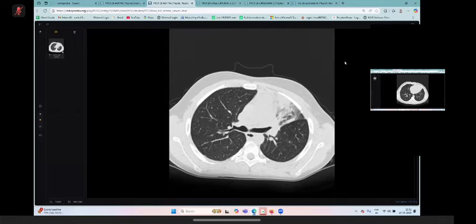All right, you did very well on this case. The only thing I would like to tell you is, you could have picked up the left upper lobe collapse, the Luftsichel sign, on the first attempt over here. If you could see that, there is a lucent crescent surrounding it. If it could have been picked up, it would be great, but it's fine. If you are able to pick it up, it's fine. But if you are not, then you should know how to manage that patient.